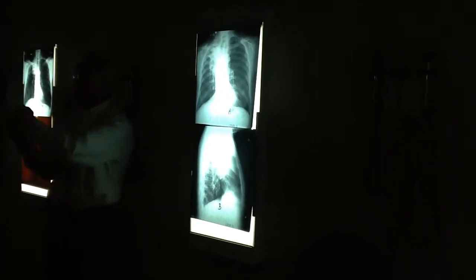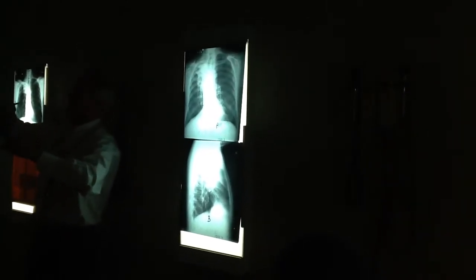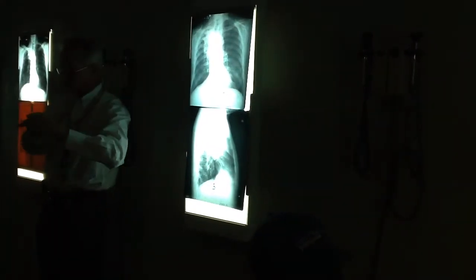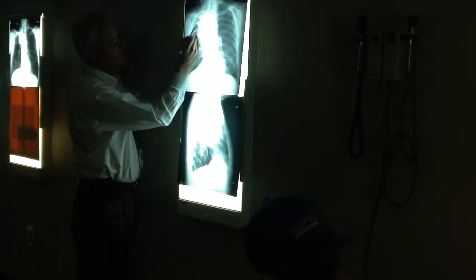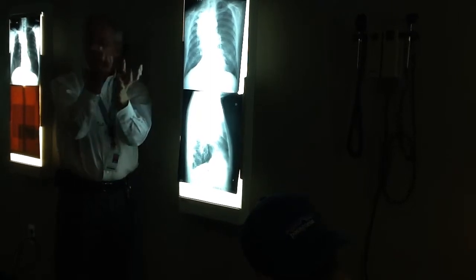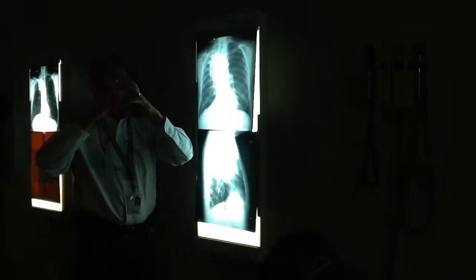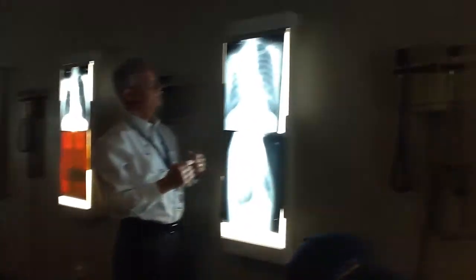So the lateral part of it keeps going up, and the medial part of it wraps around the tumor. So it does this kind of configuration. So it's really doing this, is what it's doing, like this. Because the tumor's sitting in here, taking up some space. It's in the right upper lobe bronchus, but it's expanding, getting bigger and sitting there, and the fissure's hitting it and can't push it out of the way.